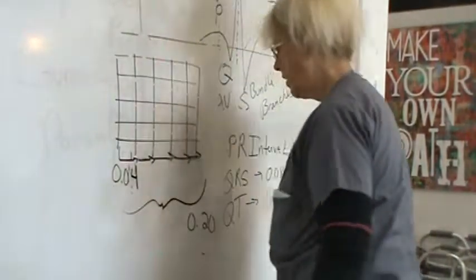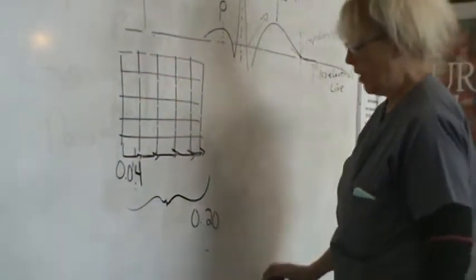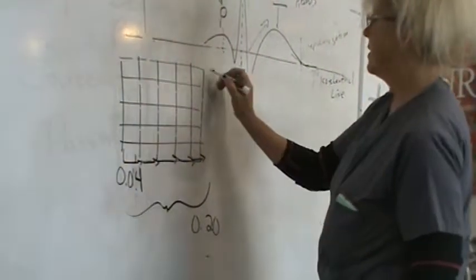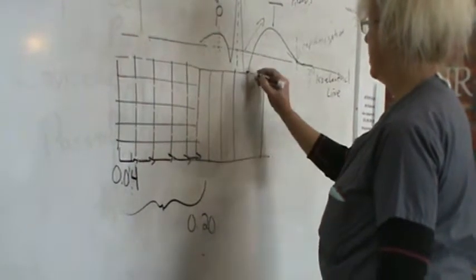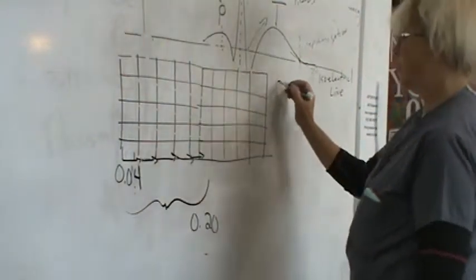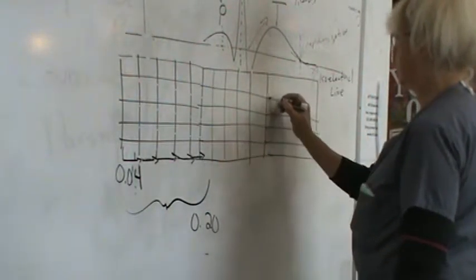Okay, so let's take a look at how we count. Obviously that's just one. I'm going to erase these since you've already written them down, so give me a little bit more room, and I'm going to continue my grid. Okay, let's do another one. And we got 1, 2, 3, 4, and 5. More and 5. Let's do another one. 1, 2, 3, 4, and 5.